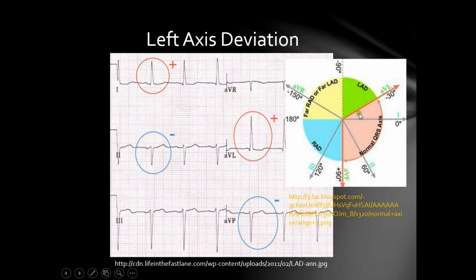It's more than 90 degrees away, remember. So the cardiac axis actually would be normal. You have to have both leads 2 and aVF negative and lead 1 positive for a left axis deviation to happen.